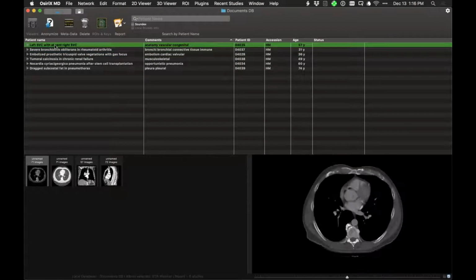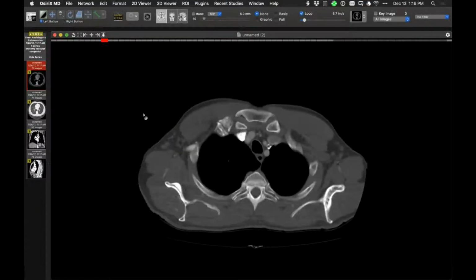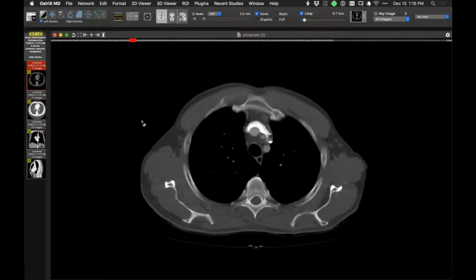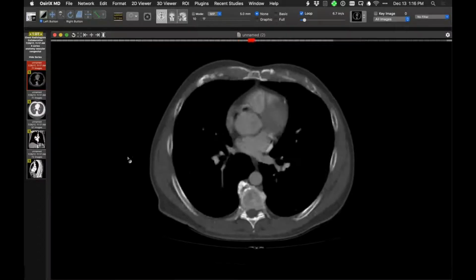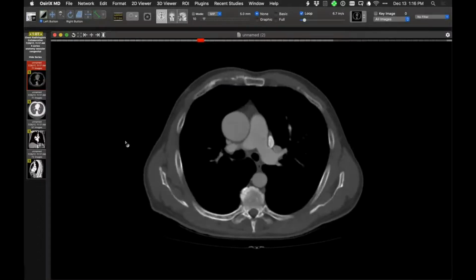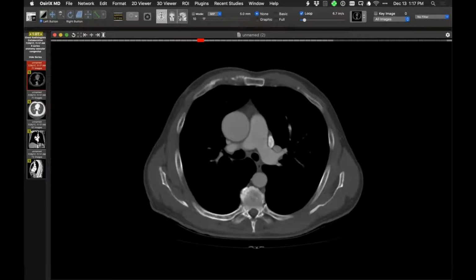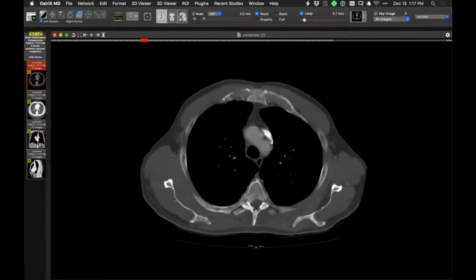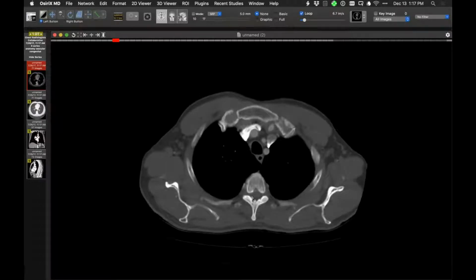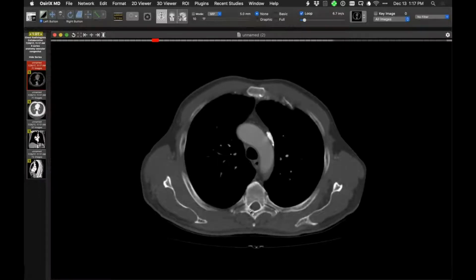Here's a nice anatomy case. So we have a person with a left SVC only. So we look and we start up here and we see there's no right SVC. Here's the left SVC. It goes to coronary sinus as it should. Of course, we're not going to have an azygous vein, but we're going to have blood flow coming up via the hemiazygous vein, an accessory hemiazygous vein. And the blood flow from the right side crosses the midline to that left SVC.